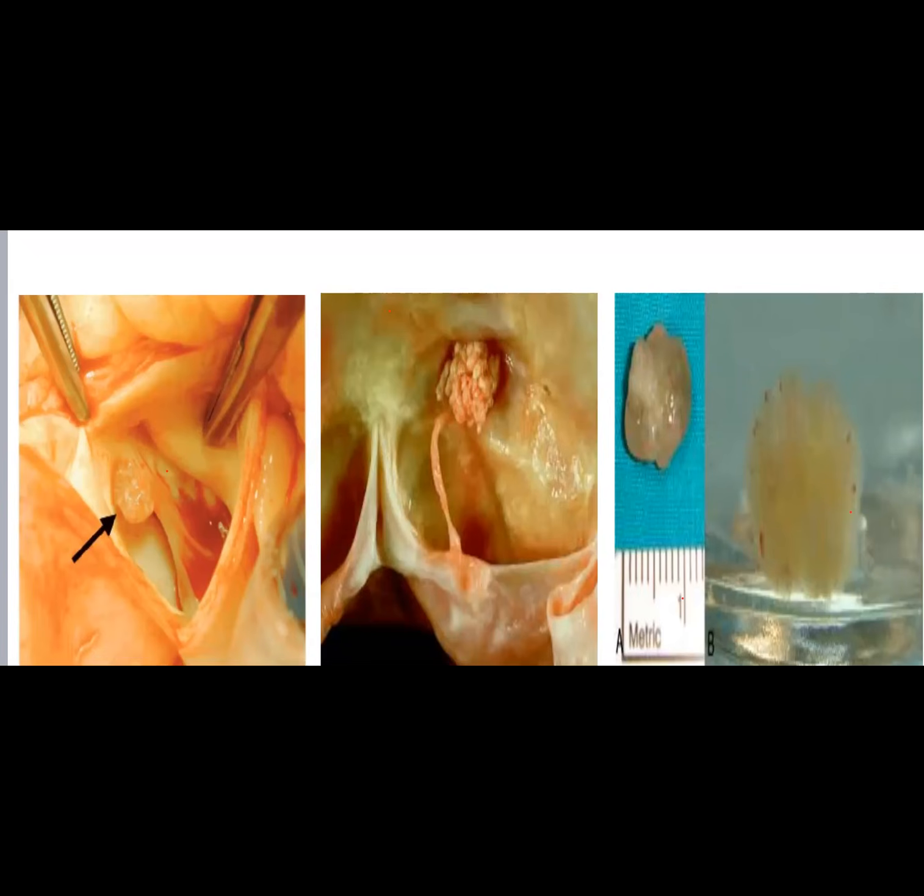Yes, right. It's a true picture, not surrealistic. So what tumor is this? Myxoma. No. Not myxoma. Fibroadenoma. Fibro... Fibroelastoma.